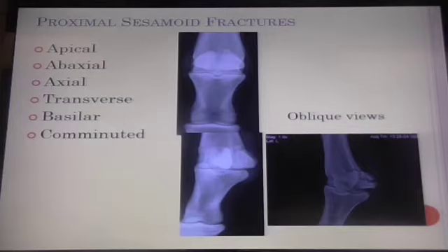So this is the dorsomedial palmarolateral oblique. So it exited on the palmarolateral. So you're looking at the opposite, which would be medial, which matched that second letter, which is medial oblique. How about that?